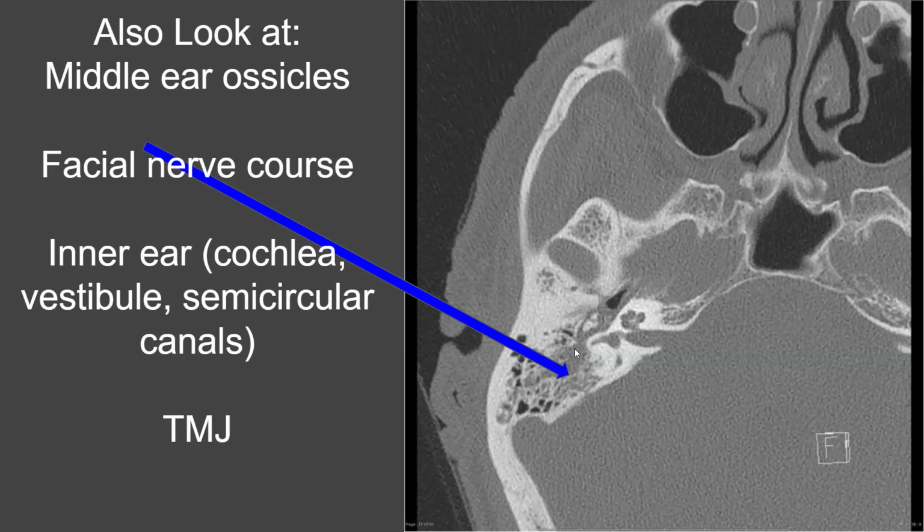Well, remember at the beginning we said there is a connection between the mastoid air cells and middle ear cavity called the aditus ad antrum, and specifically the epitympanum, or the superior part of the middle ear cavity. So here's that connection, which allows fluid and blood to flow right from the mastoid air cells into the middle ear cavity. And so, does this patient have trouble hearing? Yes, certainly. This patient will probably have pain around their ear, around the back of their jaw, right? Then they're also going to describe problems with hearing. And that might point you to a temporal bone fracture.